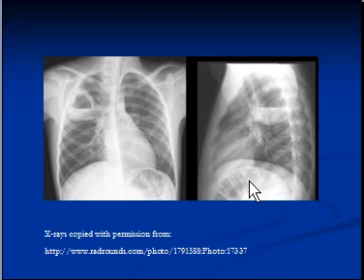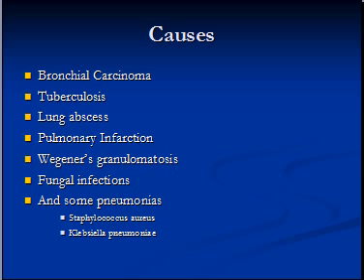You can also see air in the splenic flexure of the colon here under the left diaphragm. This patient is either rotated towards the left hand side or has some degree of scoliosis. However, to comment on the rest of the lung fields, a radiologist would need to see this X-ray in better resolution, actually in front of them.